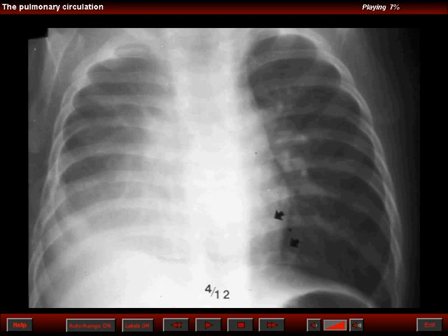The same patient in a penetrated view shows that there are markings that are directed medially, and note the evidence of haziness in the lower half of the right lung. This haziness can be either fibroadipose tissue or may represent a hypoplastic or a collapsed right middle lobe and right lower lobe.